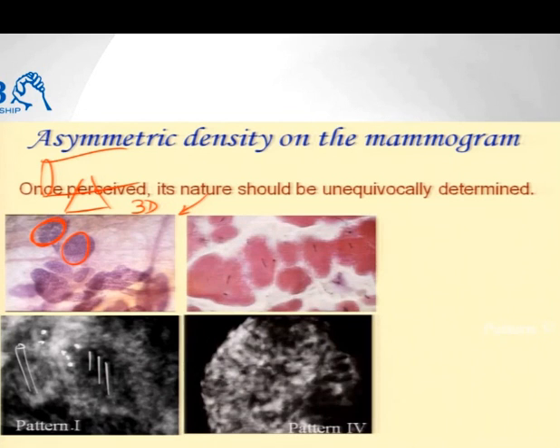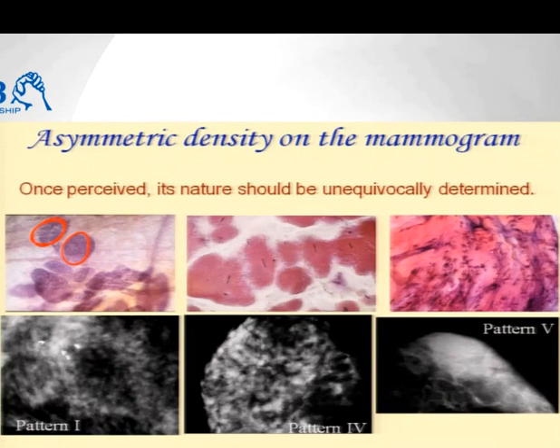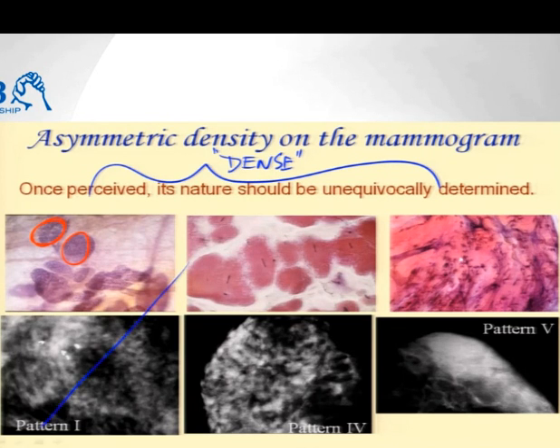This is normal. This is normal too, but it's a variant, namely a high-risk adenosis pattern. And this is what we all fear. That is, yes, the TDLUs are there, the ducts are there, but we cannot see them because of the covering dense fibrous tissue. By the way, I'm showing to you right now the 3 subtypes of dense breast. Unfortunately, we don't have time to go into this, but this is the most frequent but the lowest risk. This is high risk, 12% of all women, and this is high risk.